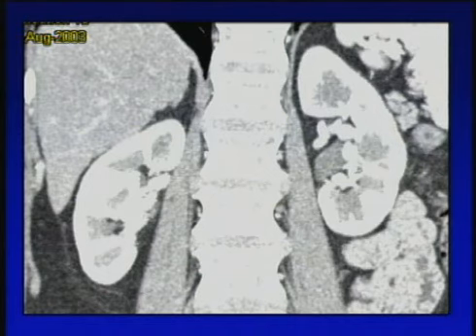Now, in saying that, sometimes it's just not going to help. Look at this case. Does everyone see the renal cancer? Well, I'll give you the right kidney, and I'll give you the upper 2/3 of the left kidney. What about right there? Well, boy, that is really hard to point out.